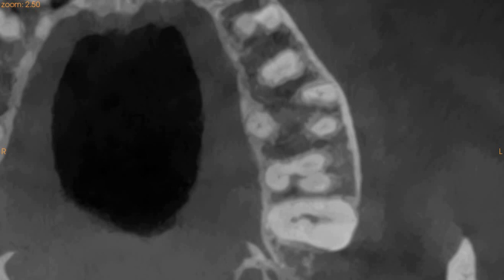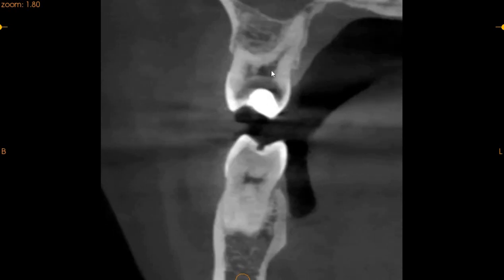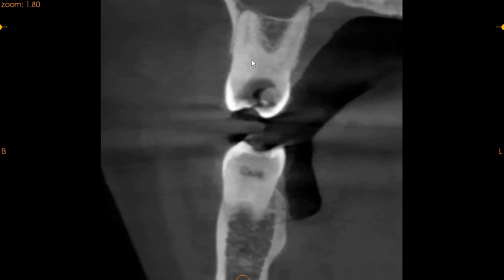Looking at the transaxial view, this is the mesial one canal, the distal one canal, and on the mesial, just to show you, this is absolutely a single canal here, and then there's a very faint MB2 present right here. So we don't see a canal tract going from the pulp chamber, so we could safely say that only a single canal will be able to be obturated, if we can't see any signs of an MB2. So that's the upper left first molar.